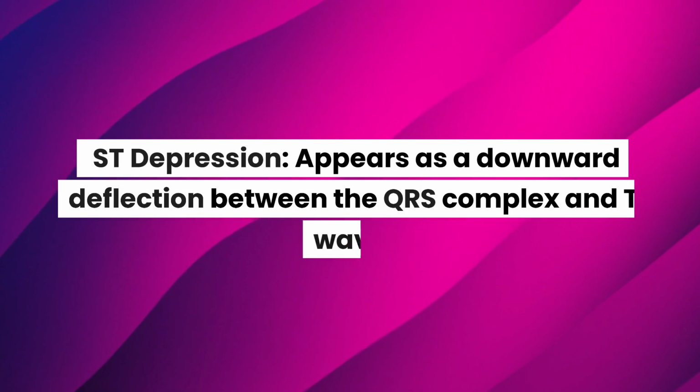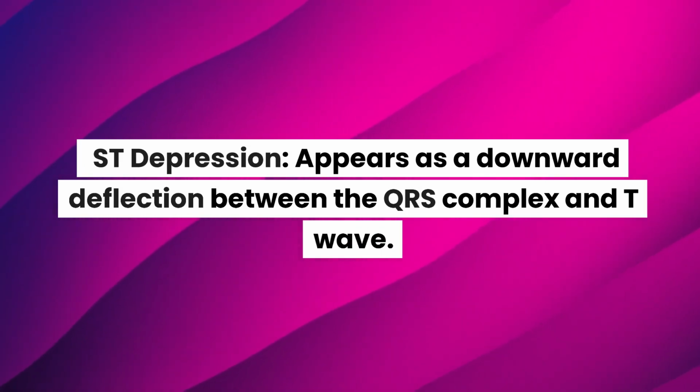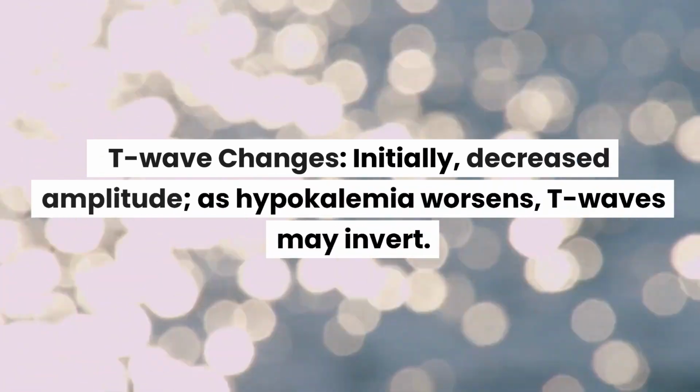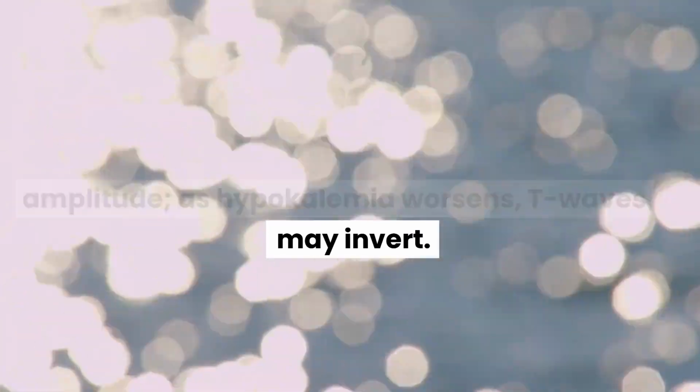ST depression appears as a downward deflection between the QRS complex and T wave. T wave changes: initially, decreased amplitude. As hypokalemia worsens, T waves may invert.